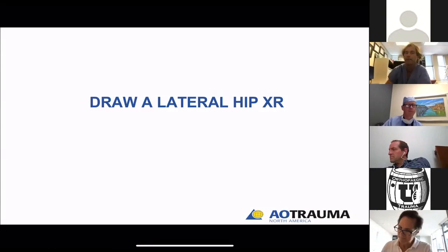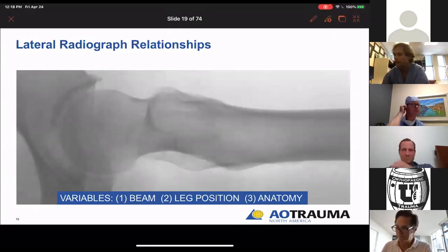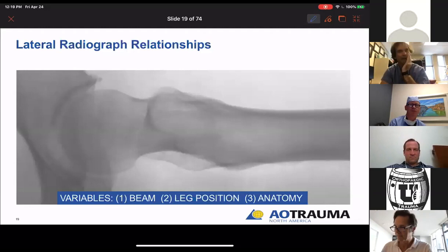All right, so I think you've probably had some time. So this is an example of a lateral hip X-ray, and I want us to spend some time with it for a second. So I have to admit, before that project and before the design of a new version of an implant, I really wasn't thinking much about the standard lateral that I had in every pertrochanteric fracture nailing procedure.